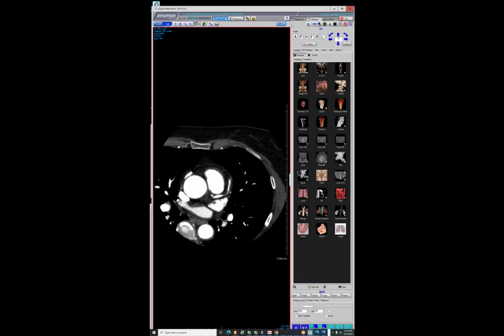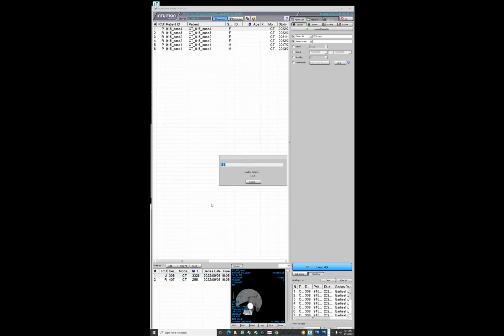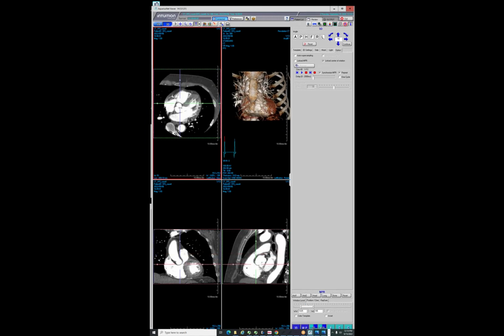So we've seen a bunch of SCADs this year. Honestly, I think they're not that uncommon. This one's very, very classic, but I think we're just recognizing them more. This one's so diffuse, but a lot of cases that we might have called something else 10 years ago, we're realizing, especially in women, how common SCAD really is.